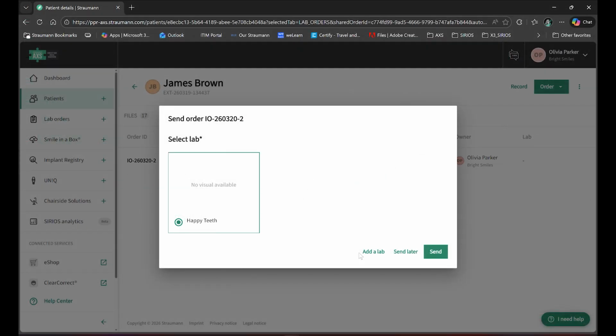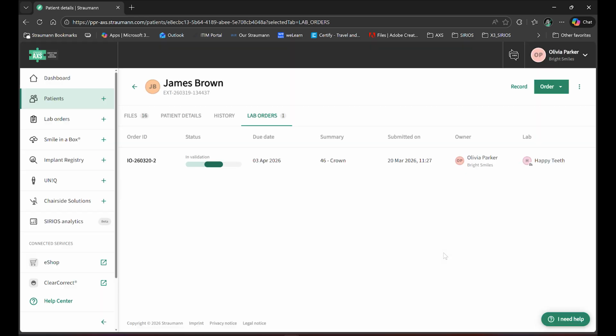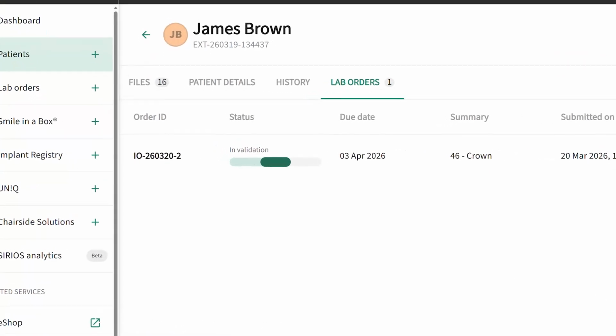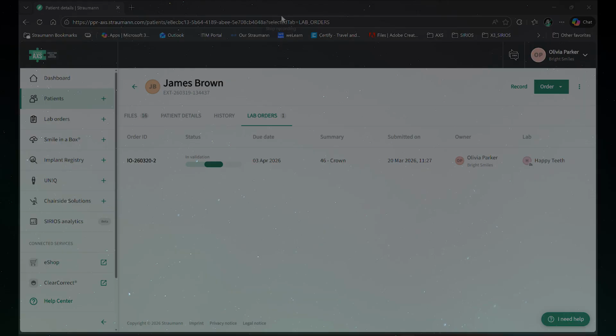Straumann Access will launch for you to select your desired laboratory. Select your lab and hit Send. The status of your case will now be in validation until the lab accepts it. For a full tutorial, refer to the Straumann Access playlist available on YouTube.